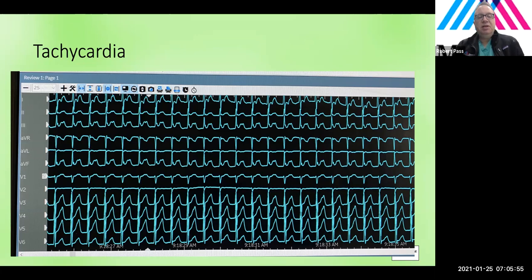So the retrograde A not only has a short RP interval, it could even be negative and precede the onset of the QRS. But if you had atypical AVNRT, you could have a long AV time and a long VA time, what they sometimes call slow-slow AVNRT. So this could be AVNRT, atypical.